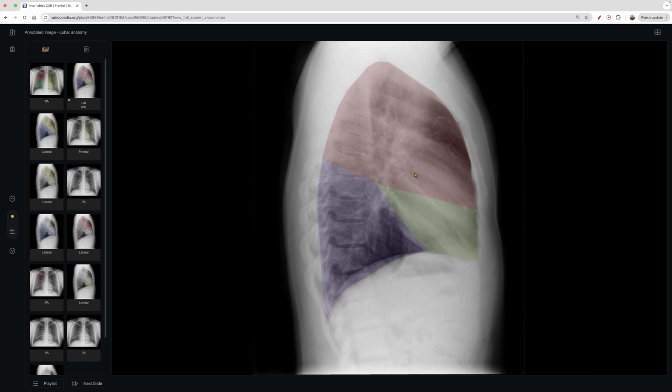And we'll talk about that a little bit later, actually very soon. And same idea here, if it's left, right lower or right upper, sometimes it can look blended, right, depending on how you look at it. And then let's go to the left view here. So for the lateral aspect for the lung, this would be the left upper, left lower.